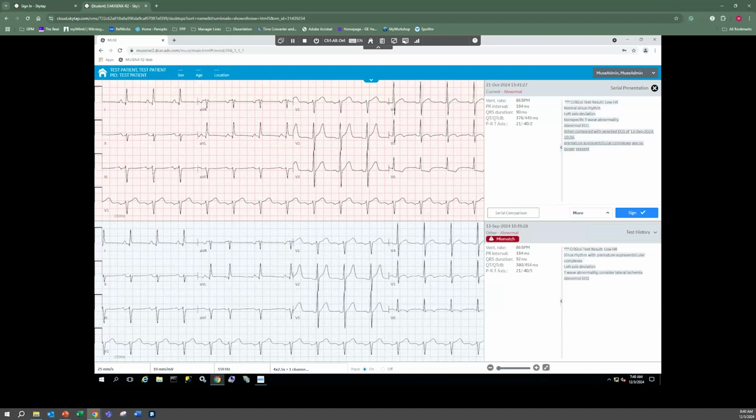The question is if it's possible to set up the system so that instead of making every normal sinus rhythm in one line, next line left axis deviation, next line non-specific T-wave abnormality, it is in one line, comma separated, so they don't have to change that again. And you can take over this easily into discharge summaries, for example. I see what you mean.